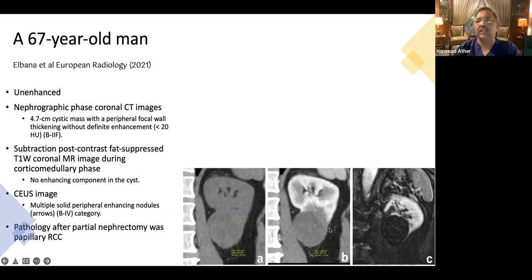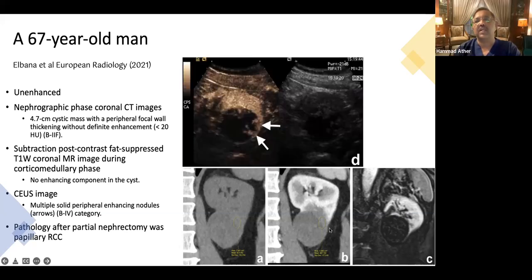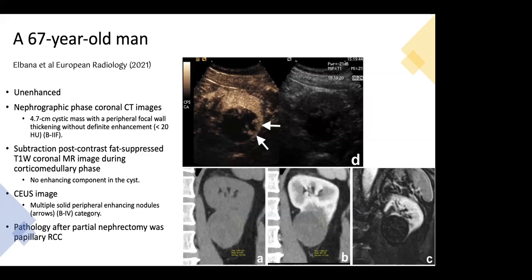Yeah. This is the contrast-enhanced ultrasound, and this is in comparison the grayscale ultrasound of the same. And you can see that this very fine enhancement that we were seeing on the contrast CT is actually quite prominent here. And this definitely fulfills the criteria. And now would you be satisfied to call it an RCC? Yes, definitely. This enhancement is very suspicious.